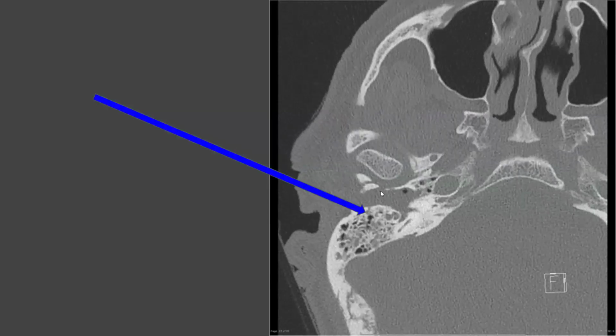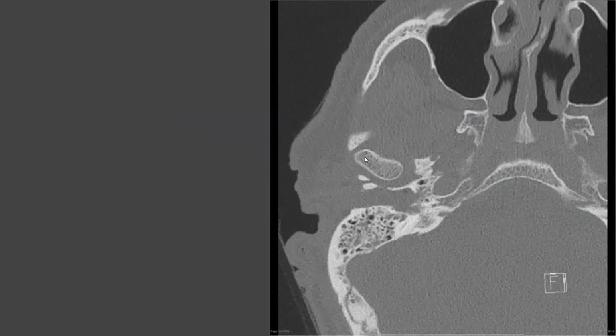What does appear involved in this fracture is the temporomandibular joint, right? So we have the temporal bone, and anterior to that, we have the mandible. This is the mandibular condyle, and the process of opening and closing your jaw requires a well-functioning temporomandibular joint. So here, when we have a fracture through it, this patient may have trouble opening and closing their jaw, which may be another telltale sign that there's a temporal bone fracture.